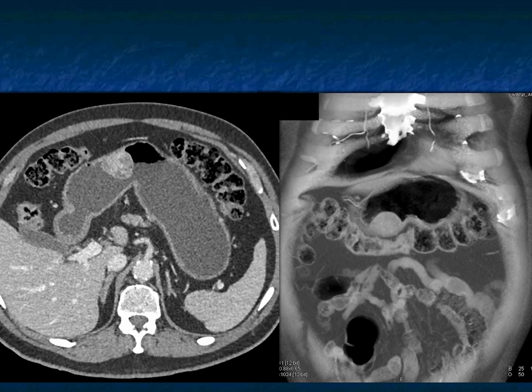Well, you surely need to exclude a malignancy. Could this be a cancer, gastric cancer? If it's not a gastric cancer under malignancies, could this be lymphoma? Lymphoma is usually infiltrating, not a polypoid mass. That would be unlikely. It could be a GIST tumor.